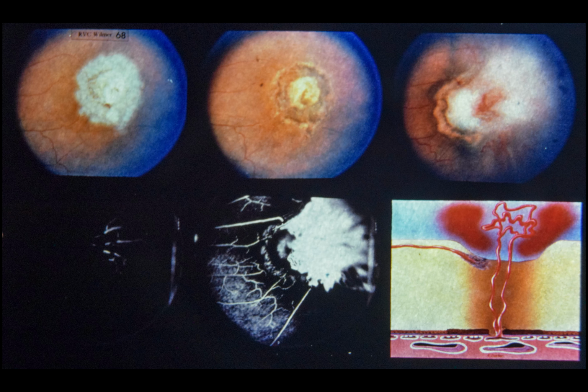In this patient, however, no beam diameter smaller than 200 microns was used at any time, and the perforation was made using a 200 micron spot at 0.5 seconds, a fairly long exposure time for argon laser photocoagulation. Thus, it appears that what we consider to be relatively safe treatment parameters, namely larger spot sizes and longer exposures, may also perforate Bruch's membrane.